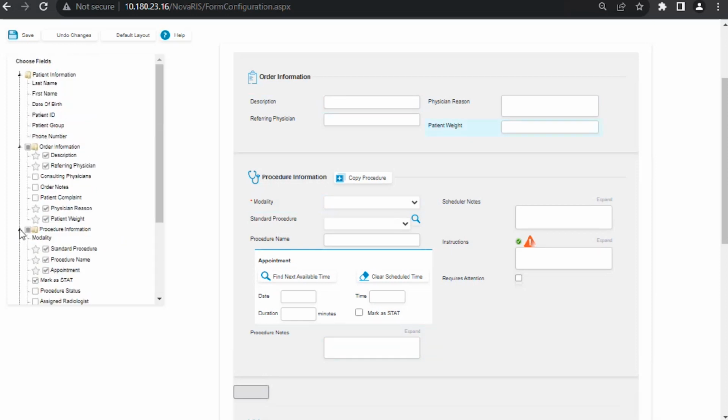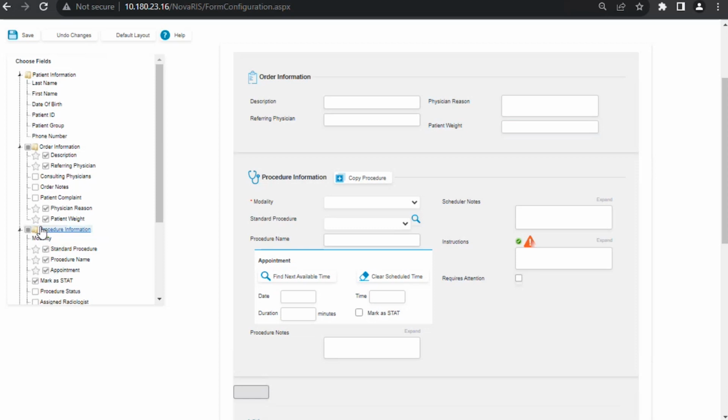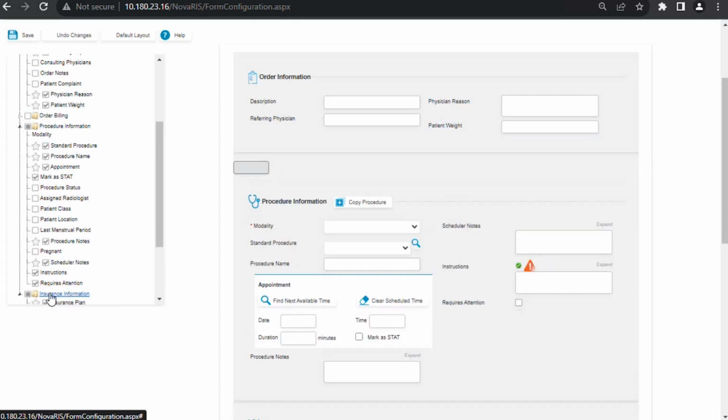And okay, I misclicked and I released it, but I still moved my mouse when I released it. So I have to be sure, and I will try to move it right this way. I keep moving my mouse when I release. So it's very picky with moving your mouse when you are moving those sections.